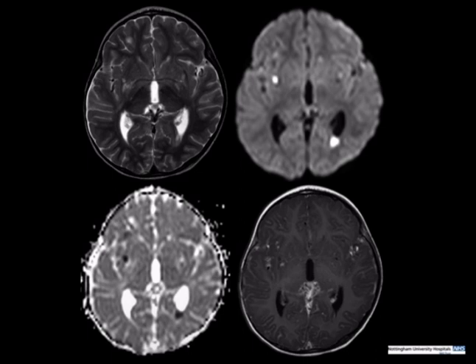But two tips I always use are: if it circumferentially coats the brain stem, that's abnormal. And if you can spot an abnormally enhancing cranial nerve, be it the third nerve or the fifth nerve or maybe the seventh nerve in the CP angle, those are convincing, definite, abnormal foci of leptomeningeal enhancement. So in the end, the diagnosis here was pneumococcal meningitis.